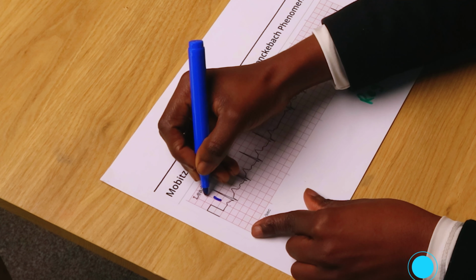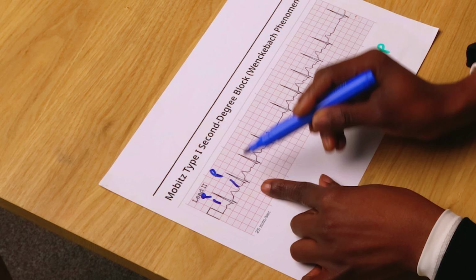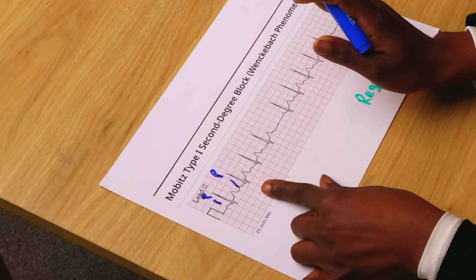So the first clue is to identify your P wave. We know that a P wave is the first positive deflection. So this is your P wave, and this is another P wave, because it's occurring as the first positive deflection before your QRS. Now that's the basics. Again, watch the video on basics if you find any part of the P wave QRS complex confusing. Now, what I need to identify is what is the pattern here?